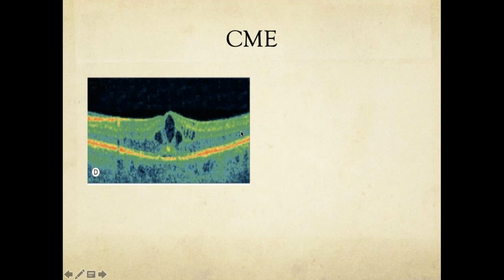So consider this as a unit, the whole retina. The signals coming from the retinal pigment epithelium and the rods and the cones are transmitted, trying to split, but I do not see a complete split because I think there are lots of connections still going on. So if I put in Avastin and this goes down, vision will be quite good.